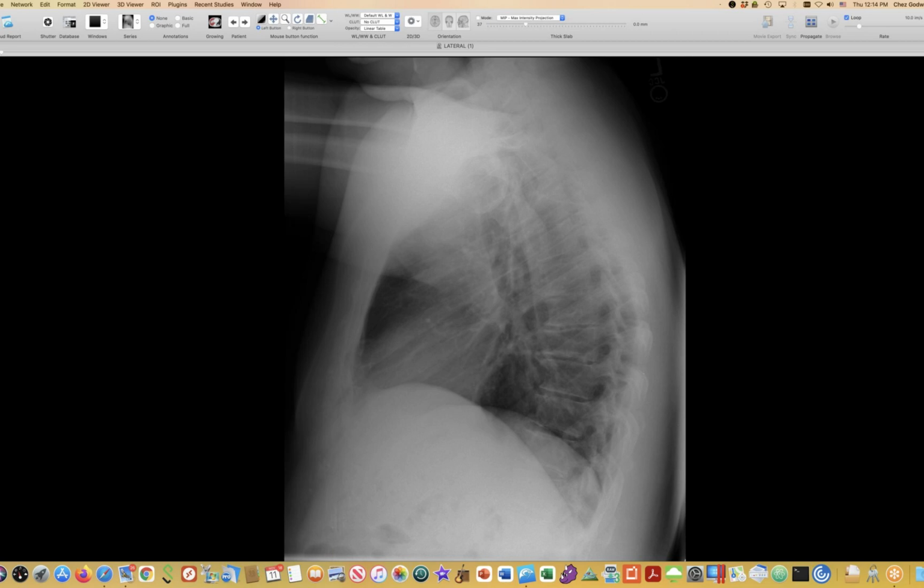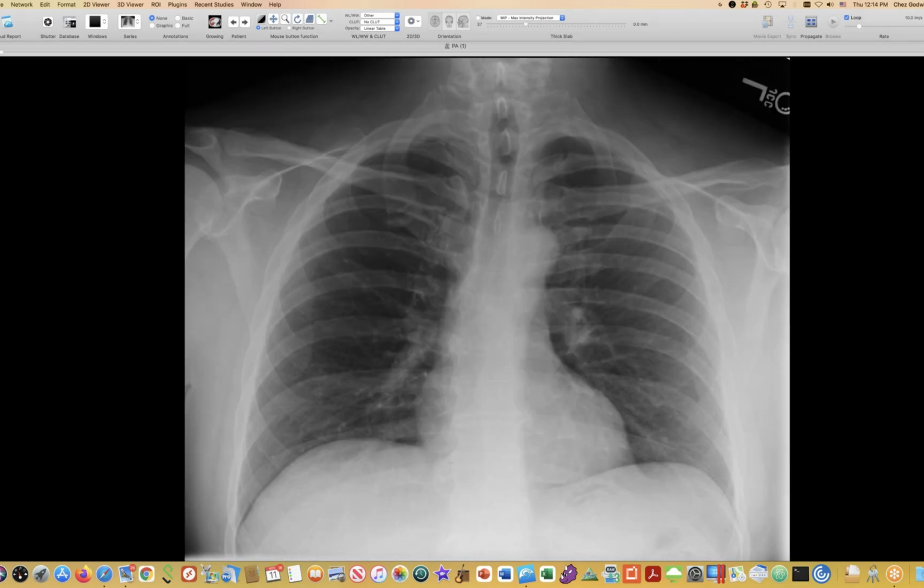And then let me show you this man who is, I think, in his 50s. This is an old radiograph from 2014 showing lowish lung volume here, but normal height of both hemidiaphragms. Then he had rotator cuff surgery on the right, and that was in 2019. And for that, they did a scalene nerve block.